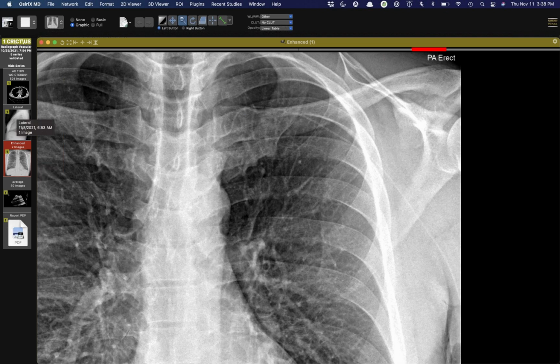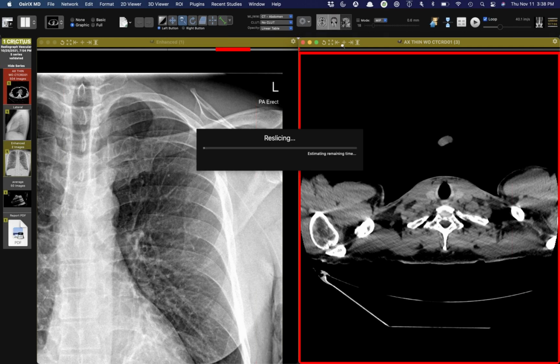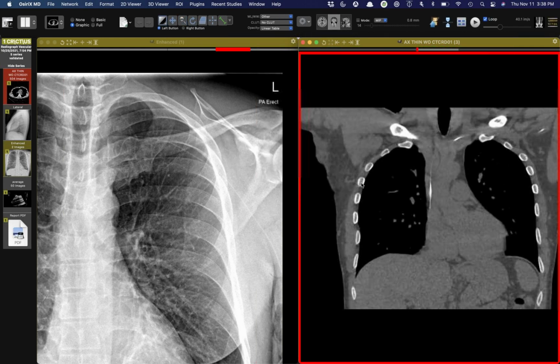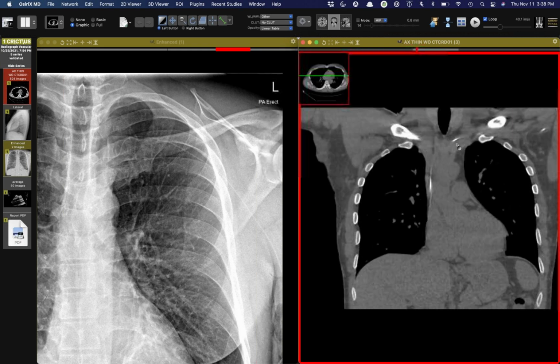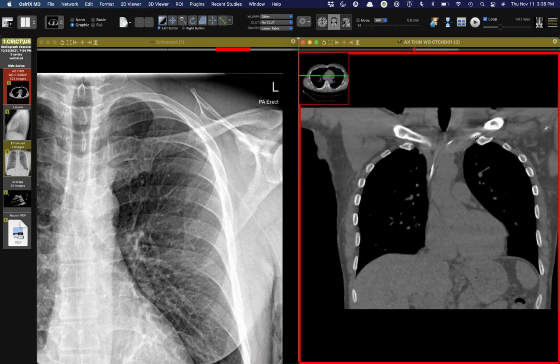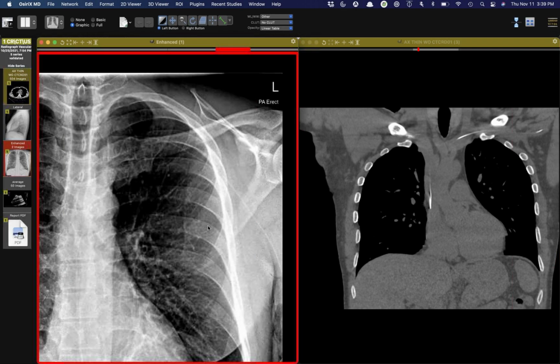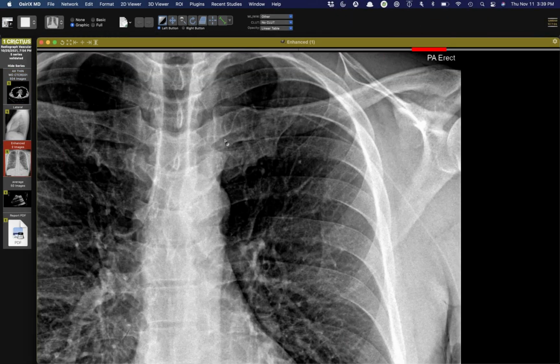And I can show you a CT from just a couple of weeks ago, and you'll see that it is in the superior vena cava. But I'm curious if anybody has ever used that kind of corkscrew or circuitous path to make a diagnosis related to the PICC. Because here you can see it's a nice smooth path on the prior CT. No. No.